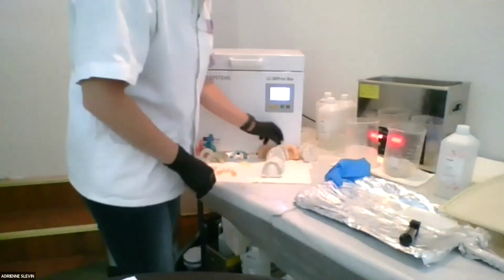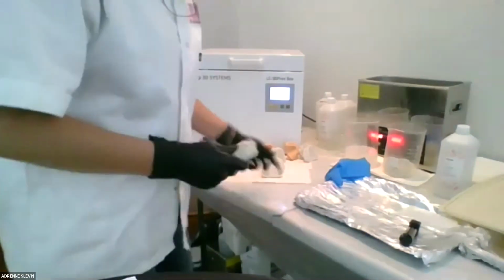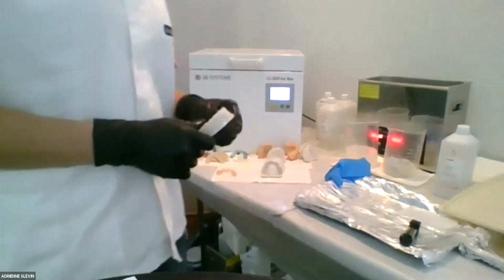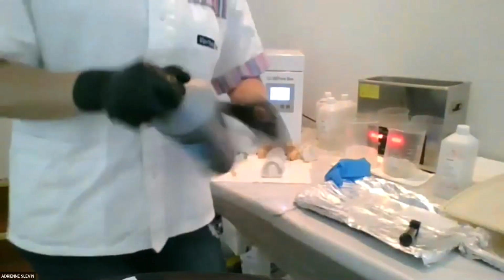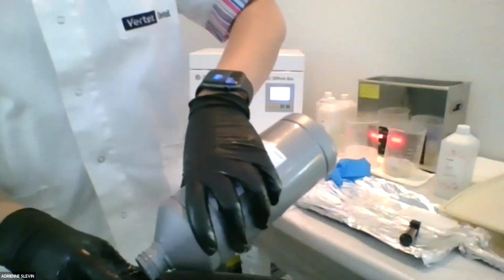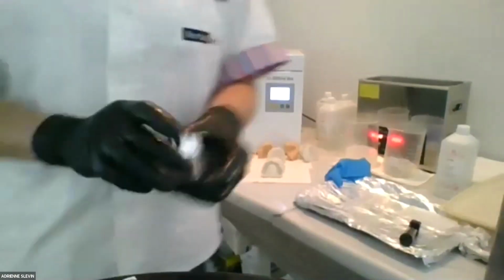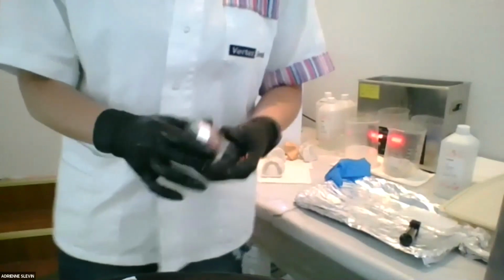Now, a little trick that I like to do if I don't want to polish, now you can see I use prosthodontic build. I've got a nice smooth surface, but you could always use a little bit of your model material before you post cure it, okay? And so I'm just gonna pour some in the cap here. But I have also, like for my dentures bonding, I have a little container. And so you could do that too. Just make sure it's mixed.